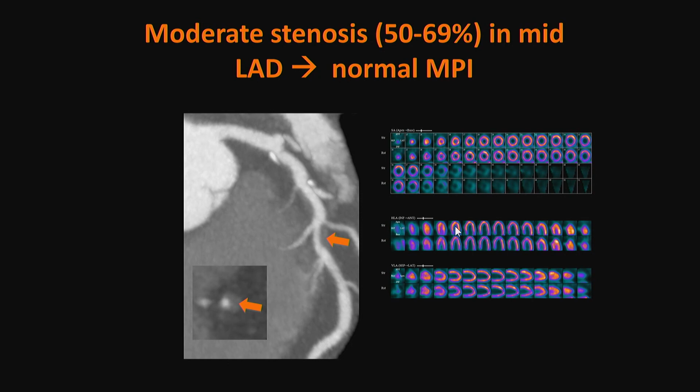On the other hand, what if this patient was actually first evaluated with a nuclear study, the study on the right here? In fact, that's what occurred in this particular case. This patient had a nuclear study. It showed no perfusion defect, but he did have some atypical chest discomfort while he was on the treadmill. And the challenge is that when you do a nuclear study and it's normal, that is very reassuring in most instances.